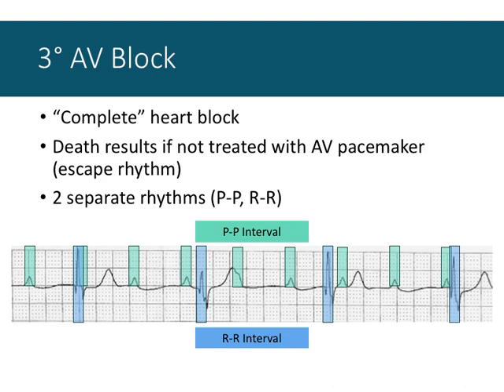And that might be something like 40 beats per minute, which now that I'm thinking about it is quite low. I don't know if that's supposed to be the case, if you want your pacemaker to run at only 40 beats per minute. Anyways, the point of this slide is to show you that the two rhythms are separated, are divorced completely.